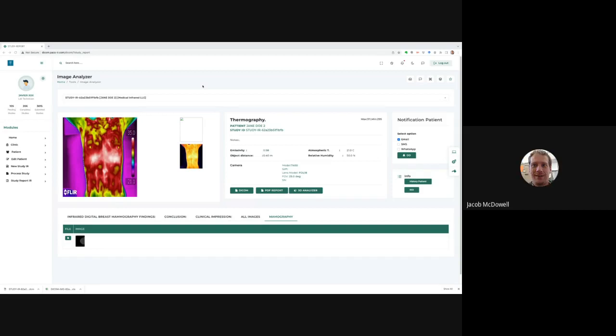Yeah. So did you see the Narami sample? No, have you seen that? Their sample report? No, I haven't. Oh, okay. Because it has basically the report, and I'm not quite sure how it compares with this. To me, I'm seeing all this, and I don't know if it's just me, but it seems like there's a lot of steps to go through. Somebody's going to have to learn how to do all these steps.